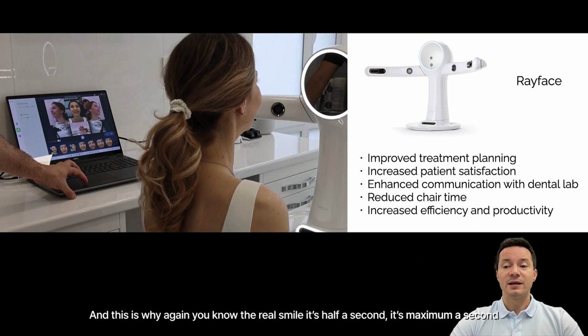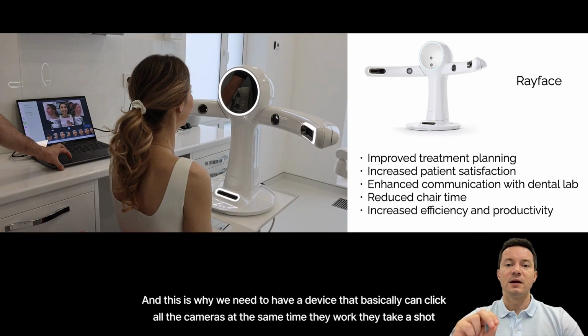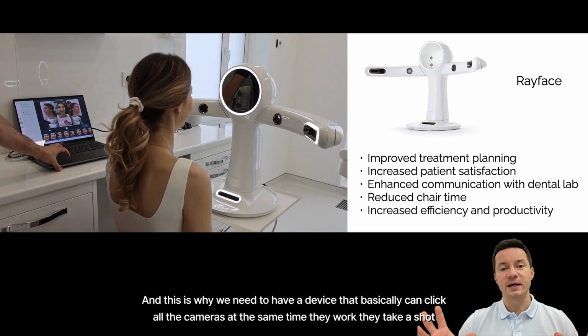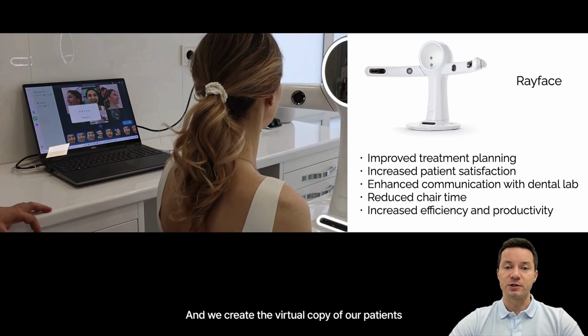And this is why, again, the real smile, it's half a second. It's maximum a second. And this is why we need to have a device that basically can click all the cameras at the same time, they take a shot, and we create the virtual copy of our patient.